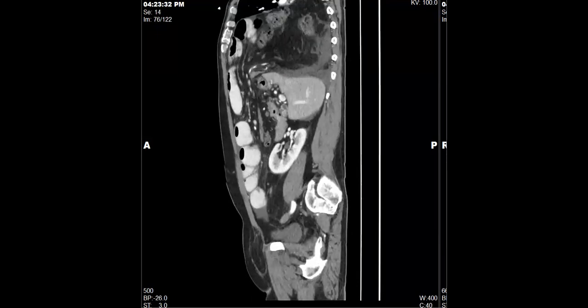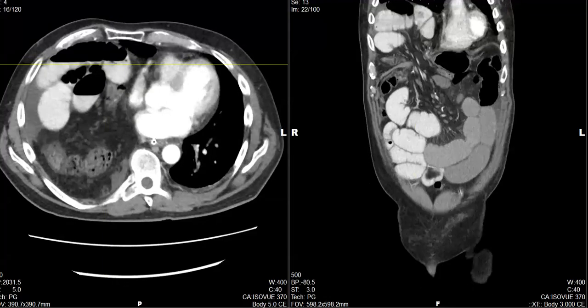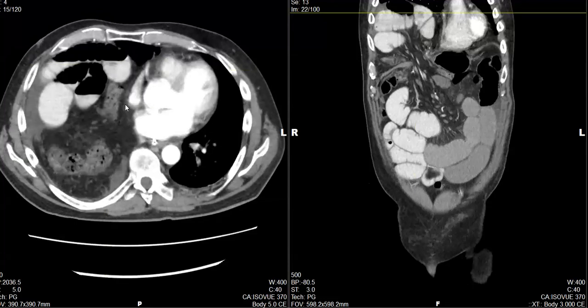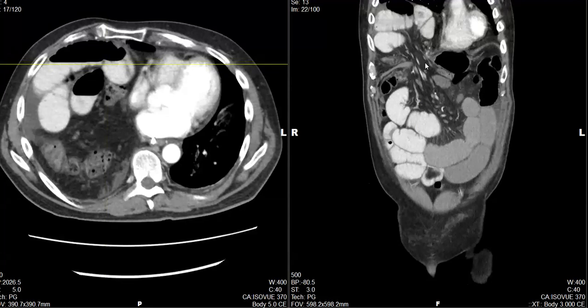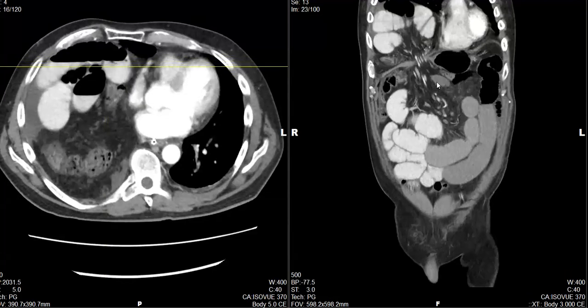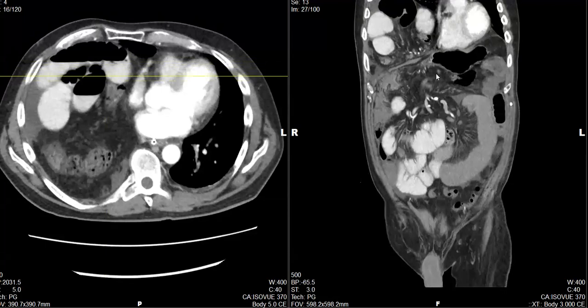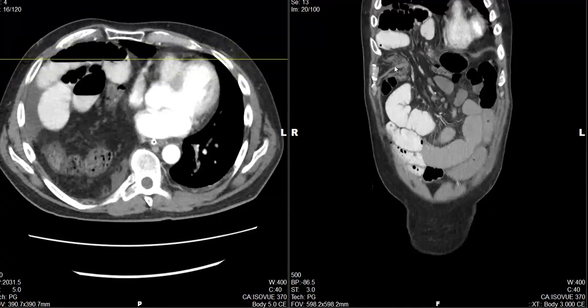So this is consistent with a foramen of Morgagni, and that is basically a sternocostal triangle space from which, if it is not filled up, there can be a bigger defect and there can be extension of contents. Usually it's omental fat, but sometimes there is extension of bowel loops that can happen through this defect.